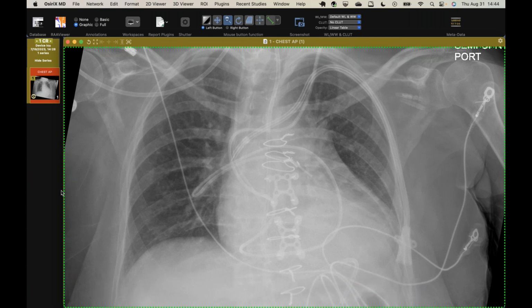No, there's another finding there. If you look in the left axilla, there are two suture sleeves there. Oh, yes, from the old defibrillator. So the patient prior to surgery undoubtedly had a pacemaker device, maybe a CRTD device. And of course, they remove that, but they don't always remove every component of it. So we're left with two left pectoral suture sleeves that they just left behind in that location. That's kind of a little telltale sign that there used to be a pacemaker there.